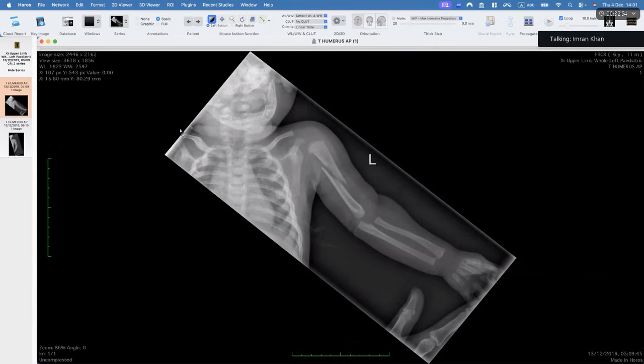All right, okay, so this is for those who are observing and obviously for yourself as well, this is a classic case of a non-accidental injury. 11-month-old, you see bucket handle type fracture of the metaphysis, spiral fracture of the humerus, and multiple rib fractures of varying ages. This is NAI.